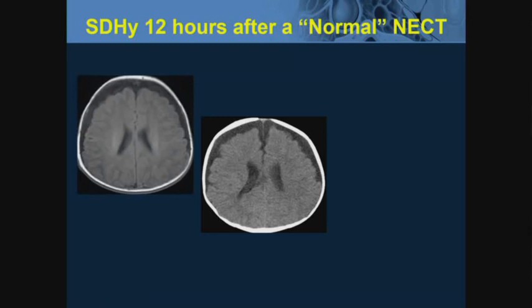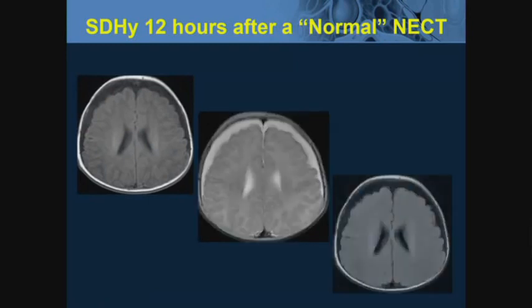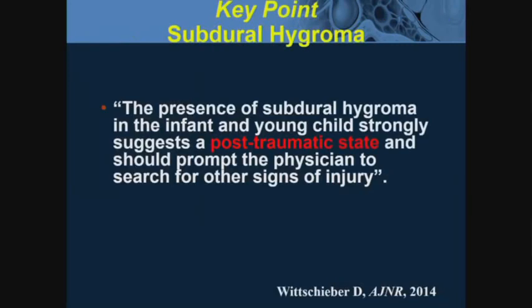Here is the MR. Here's the T2. And here's a FLAIR. This is CSF. What does that mean? This means that this infant has been injured.